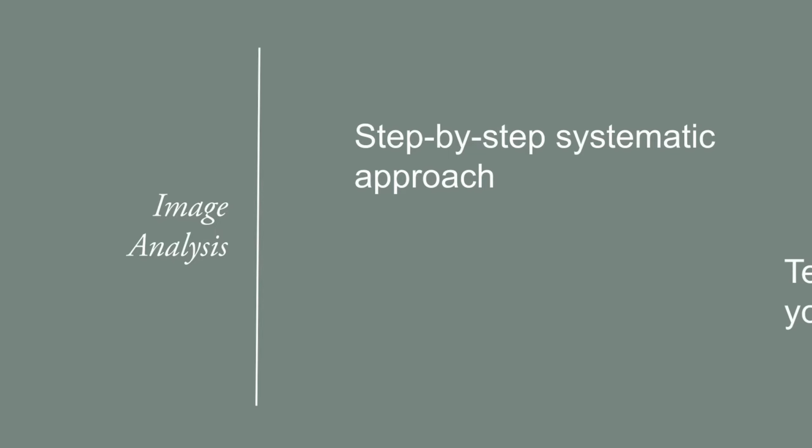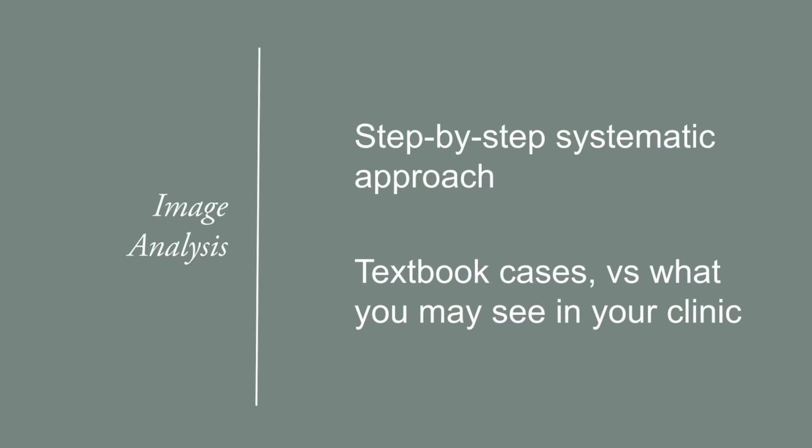The step-by-step analysis is important because a lesion on one patient may appear slightly different from the same disease on a different patient. What you have seen as an example in a textbook may not be the same presentation in your clinic. Even if the lesion in our case has a different appearance, we have to identify the radiographic features and then come to a radiographic diagnosis.